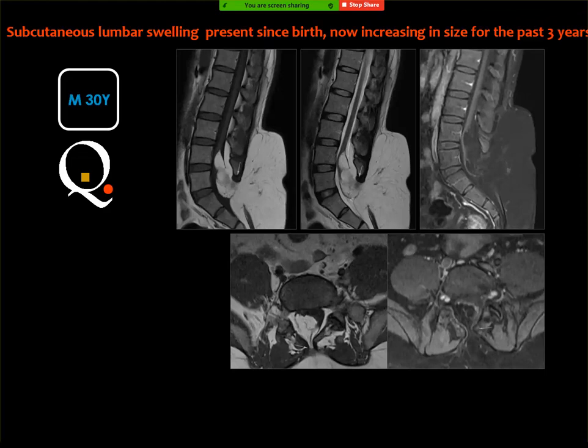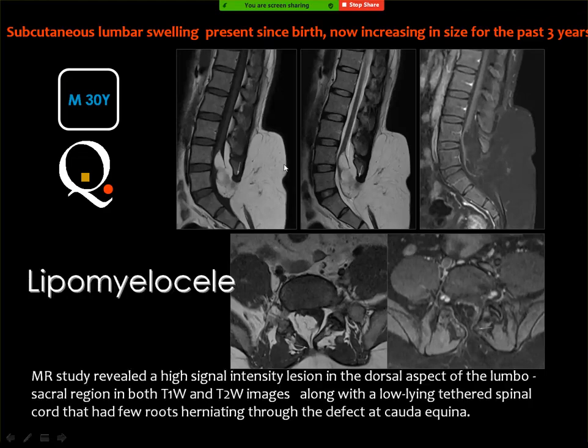Lipomyelomyelocele. Lipomyelocele. Sometimes I mentioned in relatively old lectures that this is the lipomeningomyelocele, but actually you do not have a meningocele here. You have a big lipoma or a big fatty mass that is continuous both inside the spinal canal and outside the spinal canal. This fatty mass is bright in the T1, in the T2, and dark in the fat suppressed images.